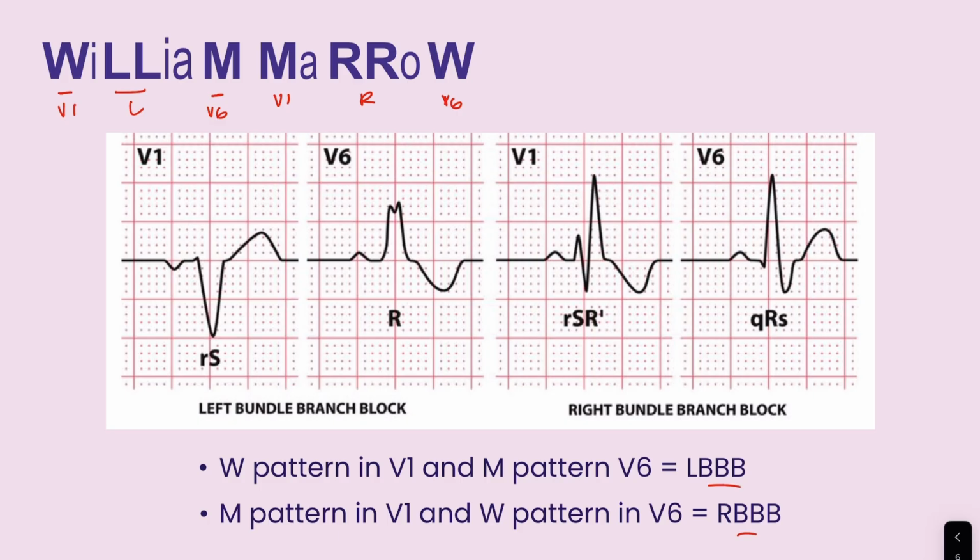So on the left side, we've got a little bit of a W going on, and here's our bunny ears, our M, our W, and our M.